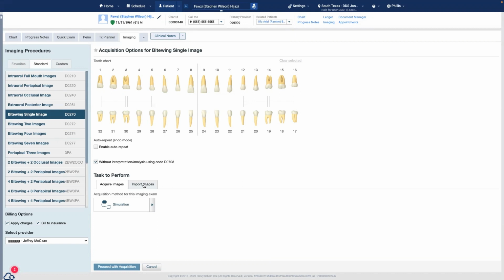Yeah, well said. You can even import images, to your point, and I'm happy to show the supported list because the list is long. Let's see if I can just bring it up really quick here. There it is, Dentrix Ascend. And while you're bringing that up, let me explain, and I talk about this in my group and my other videos, that there is a difference between direct integration and using a bridge called the Twain software.